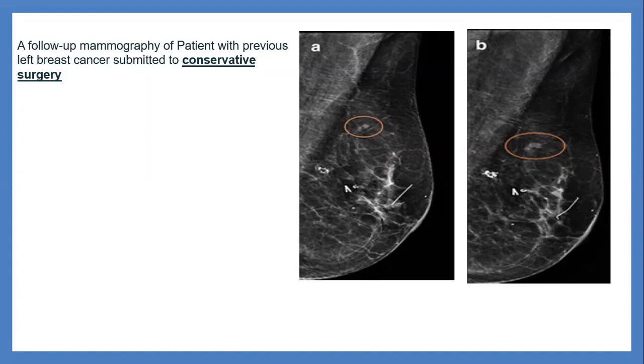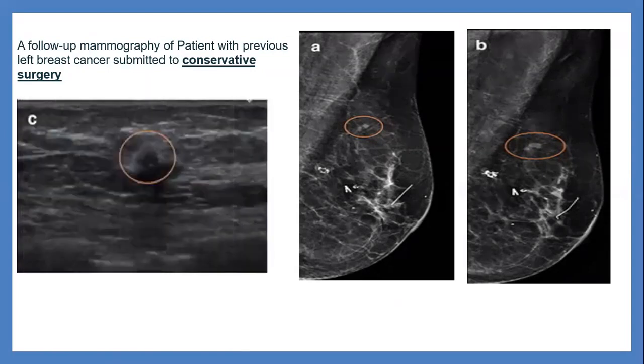You see a dense indistinct lesion. It is not typical. It can be an atypical intramammary lymph node, but it's not the typical or normal intramammary lymph node. It can be metastatic, reactive, or lymph nodes versus recurrence. So I will go for ultrasound. Yes, this is the ultrasound.